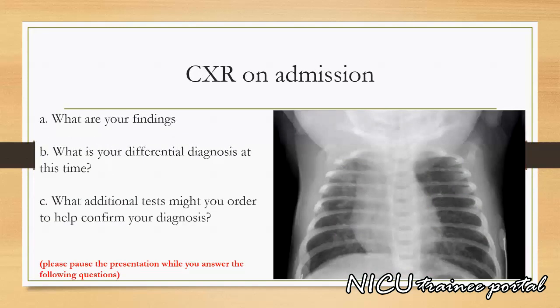Here is his admission chest X-ray. What are your findings? What is your differential diagnosis at this time? What additional tests might you order to help confirm your diagnosis? Please pause the presentation while you answer the following questions.